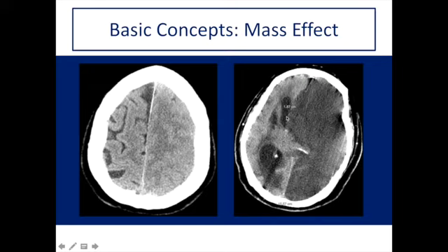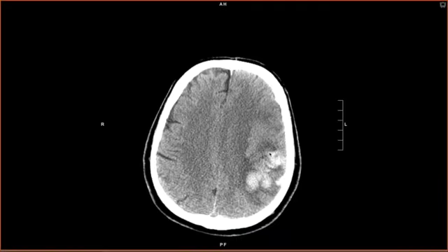The third thing we look for is evidence of other brain herniation. This is an extremely important slide. Again, if I get one thing across in this lecture, it is this. Specifically looking for herniation syndromes on every CT is unbelievably important. I'll repeat myself. In my opinion, this is the single most clinically significant thing that is missed or overlooked by beginners. Significant herniation can be easy to miss if you don't specifically look for it, and it's something that may require immediate intervention. The most basic herniation syndromes are as follows.